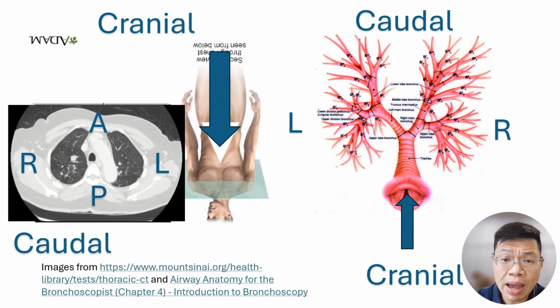Whenever we interpret a map, which in this case is the CT scan, it is important to take note of the route and the orientation of the map to get our correct bearings. Likewise, it is crucial to orientate the CT scan such that it mimics the orientation of bronchoscopy. This can involve flipping the CT horizontally so that the left and the right side will match, rotating the CT scan, or both. I will now proceed to describe some fundamental concepts of airway mapping.